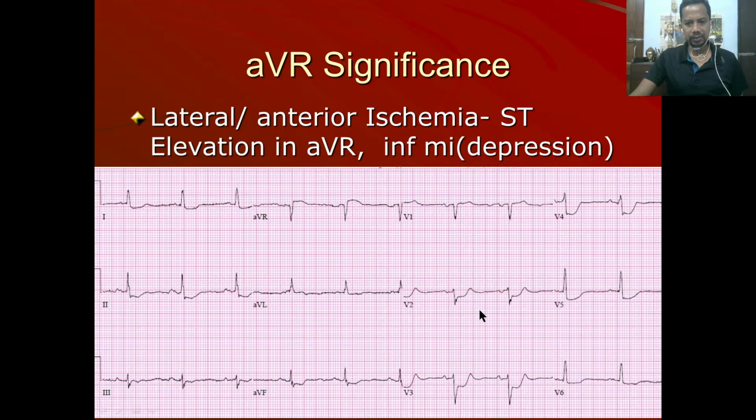So this is again, you see the level of ischemia, leads V2, V3, V4, a lot of ischemia is there. And how do you determine where the ischemia is? The PR segment is the isoelectric line, so everything has to start and come back to that point. Out here S is starting, but it is not reaching here. Roughly if there are more than 2 squares in duration and 2 squares in depth, there is ST depression or ST elevation, and it becomes significant. But you should be sharp enough to pick up a 1 small square change also.